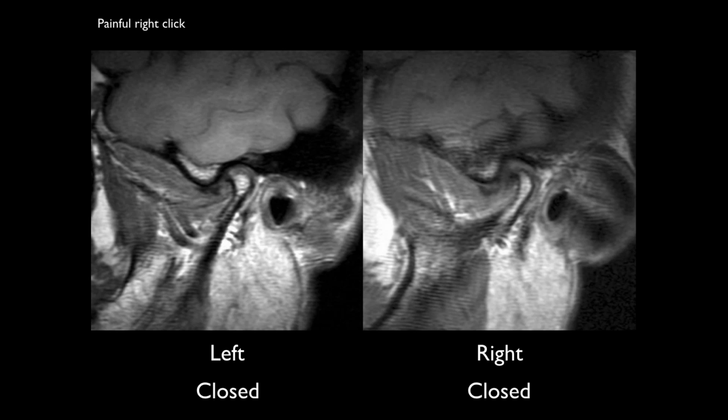Let me see who we have. Vanessa. So, Sam, what do you think of this one? Well, they're bilateral, painful, with a right click. So they're both closed, and they look pretty similar to me. So, what do you see on these?